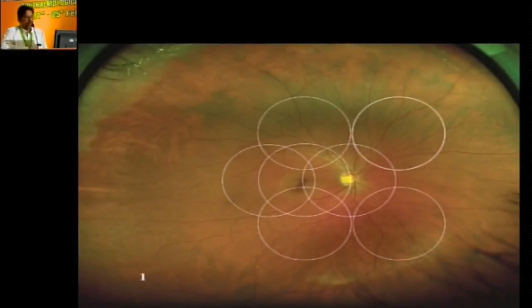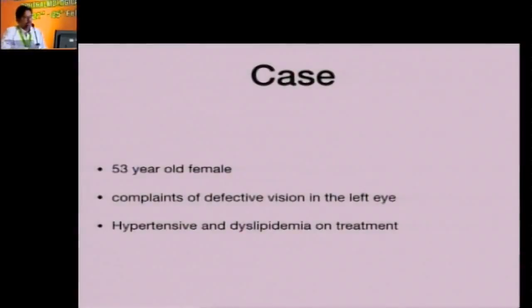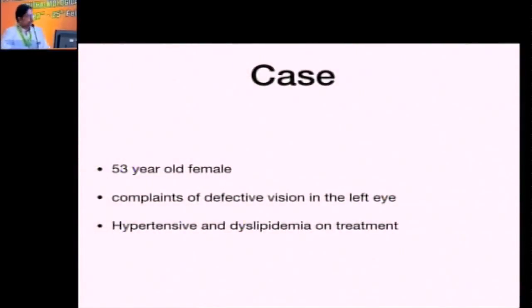Now we have the wide-field fundus photograph where you can even see the extreme periphery. The conventional photography can reach only till this zone, but in recent days we have been seeing extreme wide-field angiographies where you can pick out disease even in the periphery, and sometimes this can be the reason for improper recovery following treatment. So you can try to target these zones during laser, so wide-field angiography has helped in making us understand the nuances of all these vascular diseases.